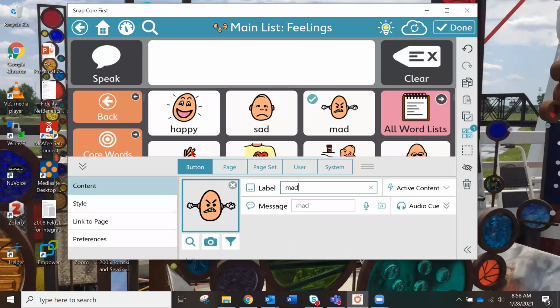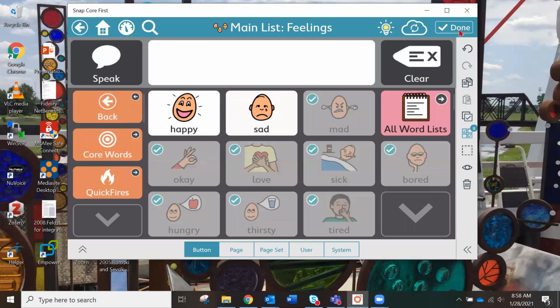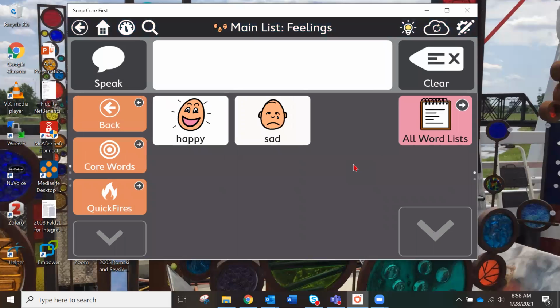So if I need to get to these other keys, if you're on your device, you can likely scroll. I'm on a computer version, so I'm going to click these down carrots here to get that to go away. And I'm going to select the rest of those keys. I'm going to say hide those keys, and then I'm going to say done. And now I just have those two keys showing. These little egghead faces is what they're called, this little egghead.